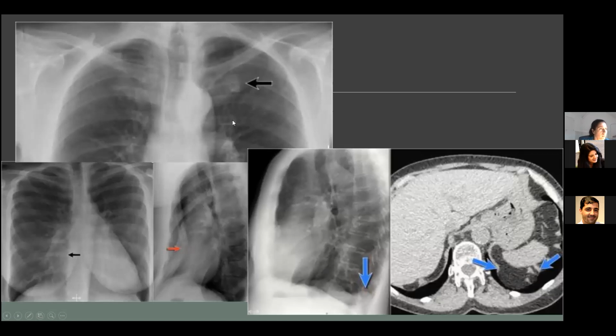So these are some pitfalls that I run into often. This is one that I hear often from clinicians. I can imagine that this density, mostly in the right or the left upper lobe, is mistaken for a mass or a tumor or something else. But this is actually a normal costochondral transition. If you look closely, you might see a translucent line between, which is actually the joint. If you look at the other side, you might see something similar as well.